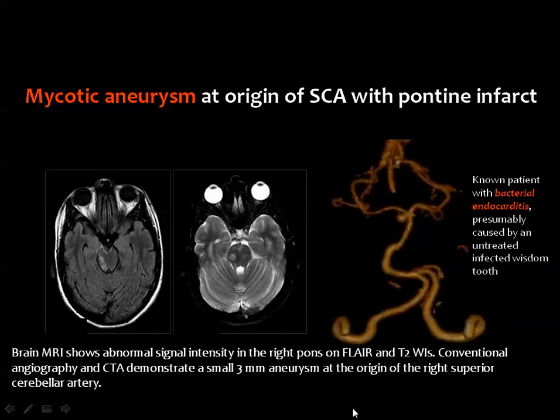And this is the 3D reconstructed image, and you can see the aneurysm at the superior cerebellar artery.